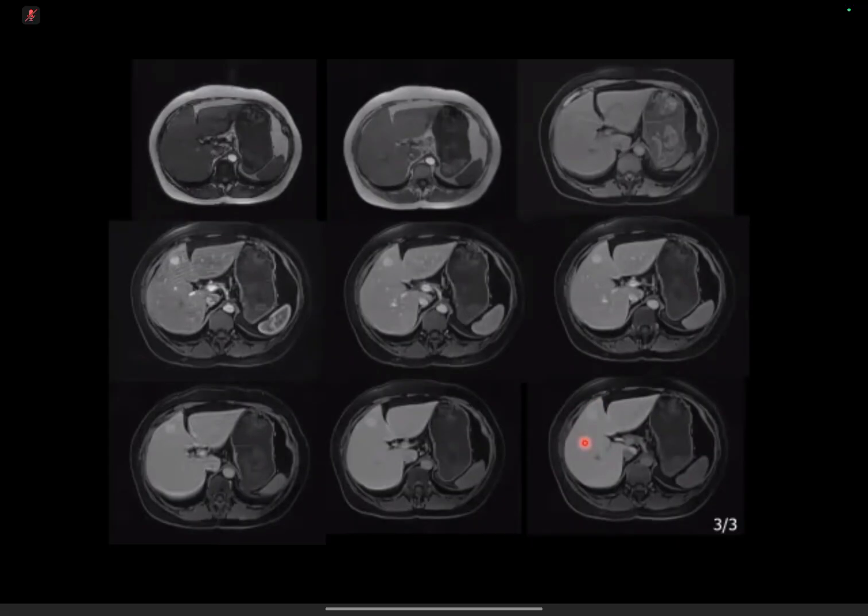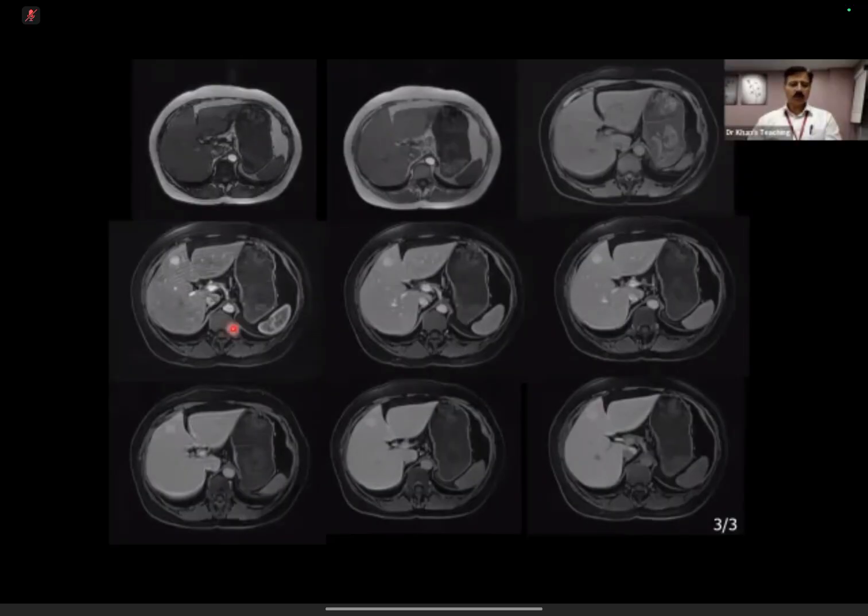The enhancement behavior of the focal lesion that we've previously seen on CT is avid arterial contrast enhancement, which is retained throughout the delayed phase, and it remains enhancing on the hepatobiliary phase. So I think this is most likely to be an FNH. Excellent. So if you see here, till here, according to our principle, it is definitely benign. And here we have clinched the diagnosis because it contains normal hepatocytes which retain contrast.